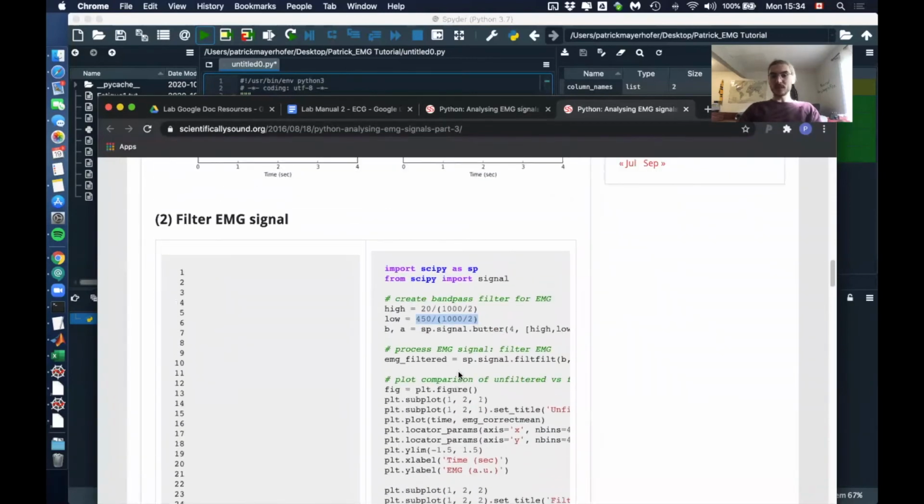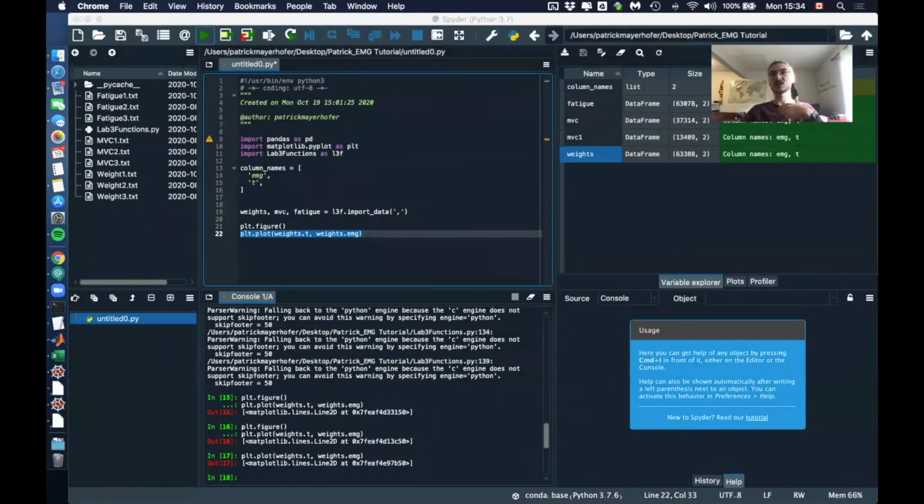So the cool thing with this website is, I'm, by the way, also gonna put a link into the description of this video. I would really recommend you opening this now, because you will probably want to copy and paste a lot of those things, because most of the code that is written here we can almost use directly. So I'm gonna put this away now, but again, I suggest you opening it now and maybe even reading a little bit over it so that you understand what's actually going on. You probably learned most of this already in our lectures, but it will definitely make sense to directly understand it with this data here.